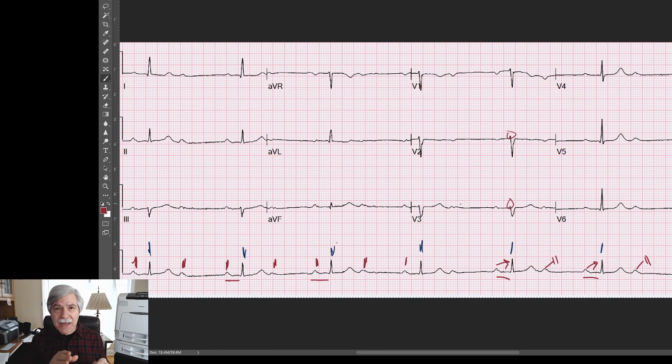So your atrial rate's faster than your ventricular rate. Your ventricular rhythm is an escape rhythm, and so it's regular. It should be perfectly regular and honestly slow. Sometimes it's a narrow QRS, and you can call it a junctional escape because it's running at a rate of 40 to 50. Sometimes it's a wider QRS complex at lower rates like 30 to 40. Then you can call it an idioventricular escape.